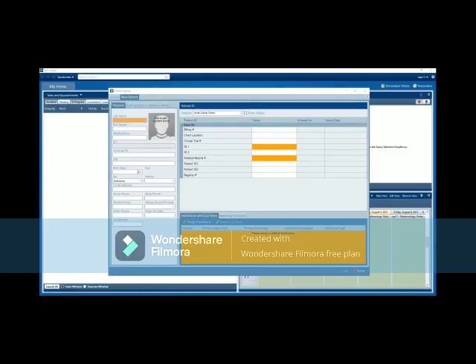Patient Explorer has been modified to allow for the addition of external organizations and referring physicians to patients when creating a new patient in ARIA. The new look to the window includes 2 tabs, labeled Institutions and Care Team, and Referring Providers. Use the Institutions and Care Team tab to assign institutions and assign a care team.